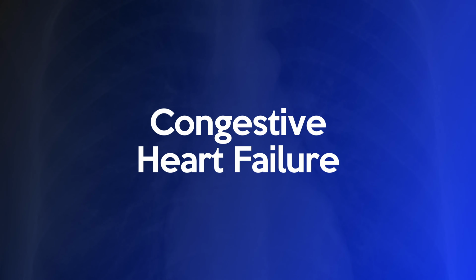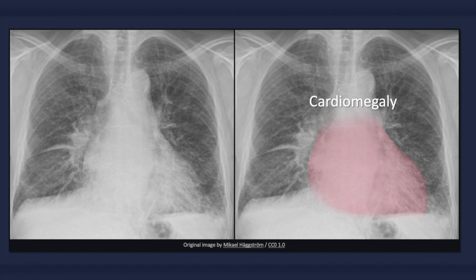Cardiomegaly, particularly in concert with other findings, is a suggestive feature of congestive heart failure. However, keep in mind that congestive heart failure can occur in the presence of a normal-sized heart. Cardiomegaly is said to be present when the cardiothoracic ratio is greater than 0.5.